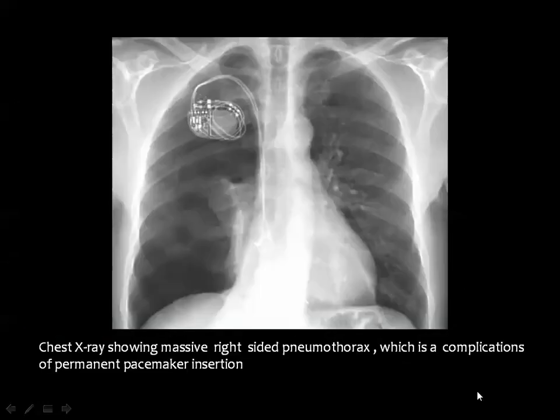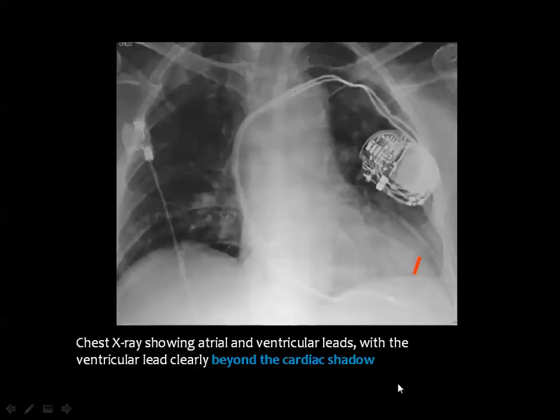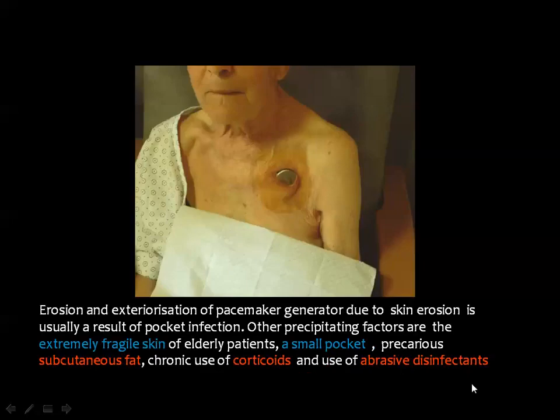But this is a large pneumothorax complicating the pacemaker with almost subtotal collapse of the right lung. Here is an example that suggests myocardial perforation, since you see that the tip of the lead is beyond the cardiac shadow, and actually it may perforate the myocardium.